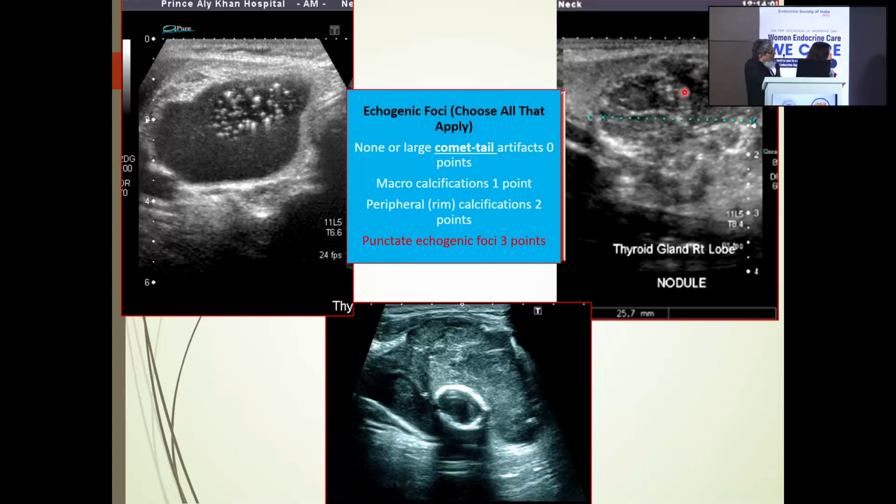So these are punctate psammoma calcifications, which make this nodule highly, highly suspicious. This is one of the signs: a hypoechoic nodule with psammoma calcification. I think this is what radiologists look for, and even if you were to see it on the film and the radiologists haven't addressed this, you are likely within your right to ask whether we have missed such calcification.